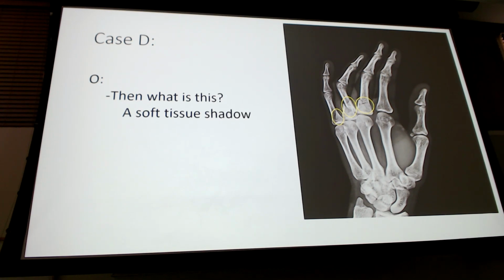That is a soft tissue shadow. Now we talked about bone shadows a little bit, but this one is not the bone that's hiding it. It's the soft tissue of the fourth digit coming down in there. That is not a fracture. How do I know it's soft tissue? Well, when I go through my stepwise process, I see my skin. I see my soft tissue coming in there.